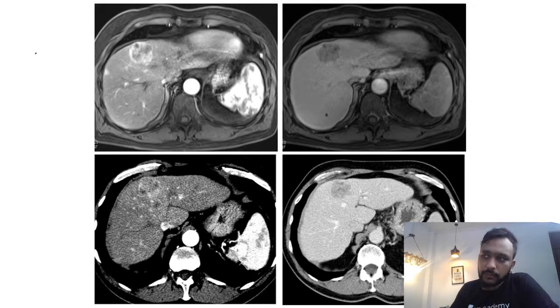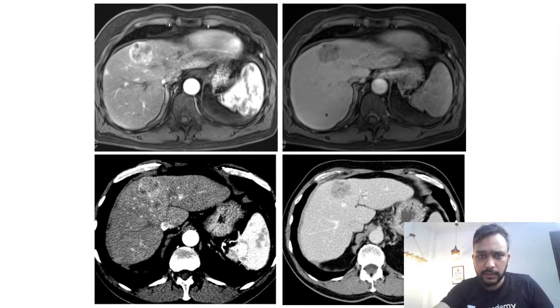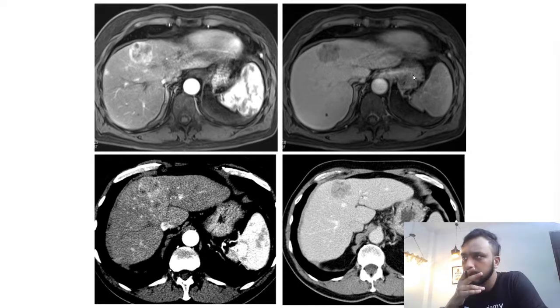Now, guys, moving on to the next image. Anyone, guys? What are you able to see in this image?